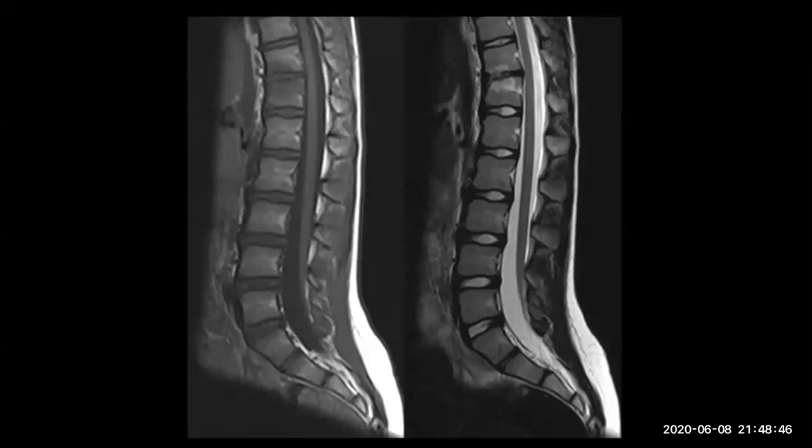Could be discitis. Why discitis? Discitis is due to infection. I think in discitis there is marrow edema, but it's not signal intensities. Maybe irregular, with increased signal intensity. Okay, we have high signal intensity in the adjacent end plate and signal change in the disc. Well, this is one finding.